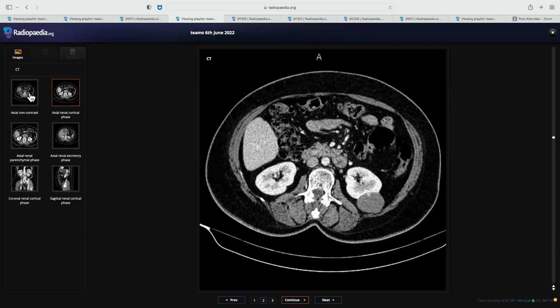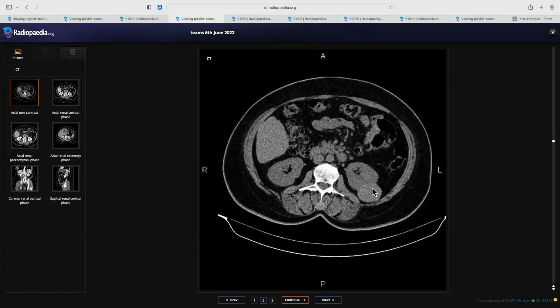So this is a cyst with hyperdense contents with an enhancing mural nodule. So then you have to yourself tell that according to Bosniak staging, this will be a type 4 cyst. The examiner should not be asking you how do you classify. That helps if you tell yourself. And of course, then you were right in telling urological management and everything you told. That was very nice.